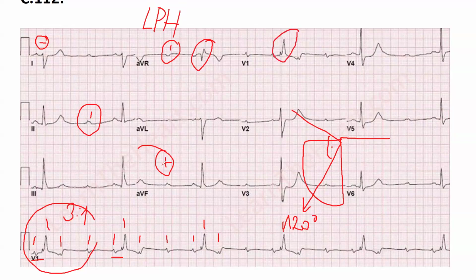The QRS, they don't look the same. What do you mean? Some are wider and some are more narrow. All the way it is wide, but you don't know the beginning and the end of the QRS. It's okay. Look at V1.